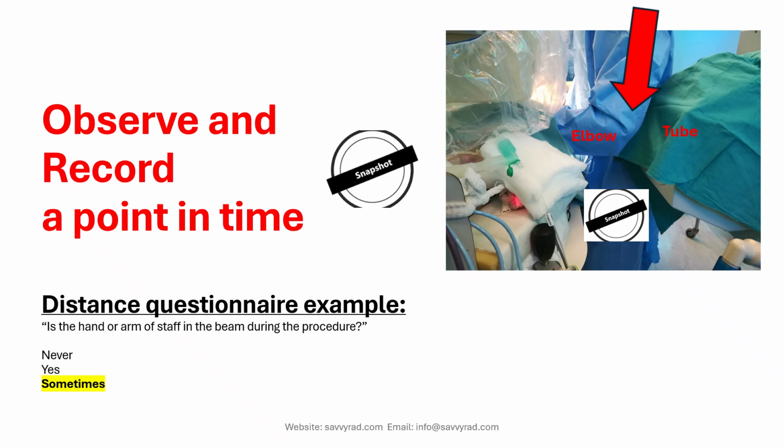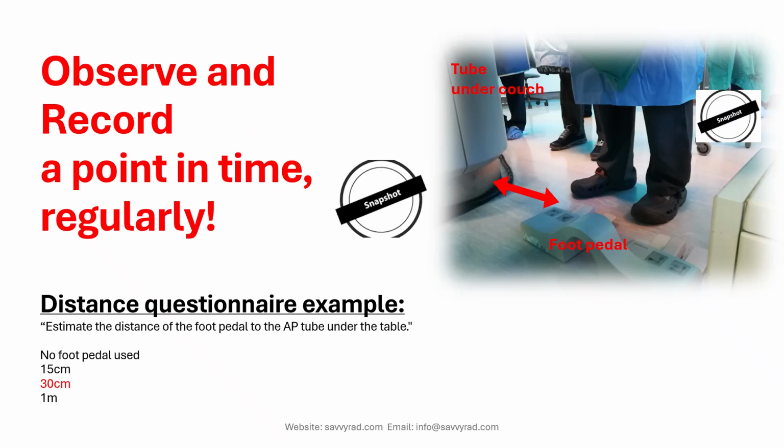In this example, the question is the hand or arm of staff in the beam during the procedure? We always want to say no, it's not, but when we observe, sometimes it happens, and then we can say sometimes.